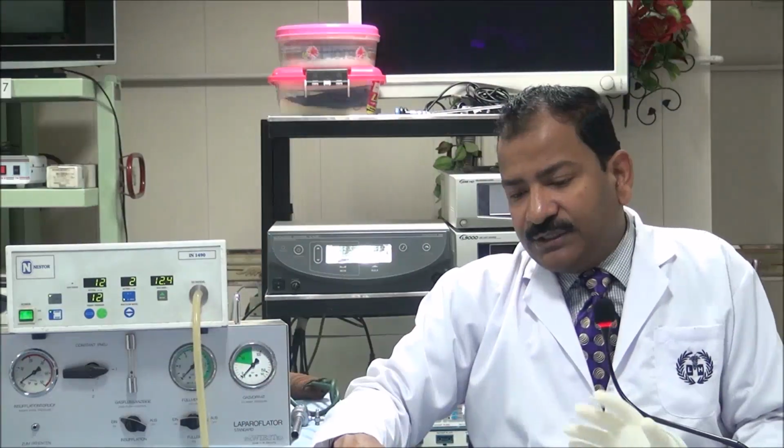Now, next question. Preset pressure is 12. Actual pressure is 12. Flow rate is 0. And total amount of gas used is 200 ml. Then where is the gas going? Small bowel? It's not in a small bowel.